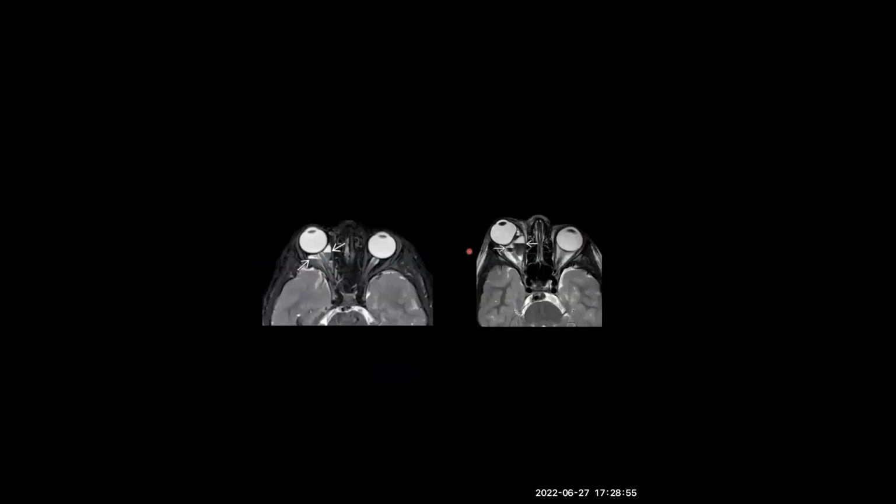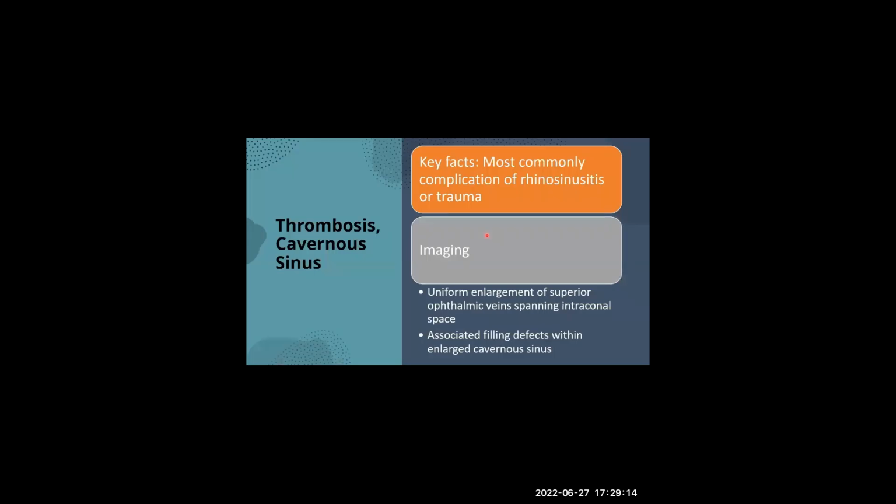Mainly the lymphangioma or lymphatic malformation presents with fluid signal. In these cases, the fluid is due to hemorrhage, so you will find the fluid and the hemorrhagic component, appearing as a fluid level. Okay, this is one of the complications. Don't forget the proptosis here. Thrombosis of the cavernous sinus.